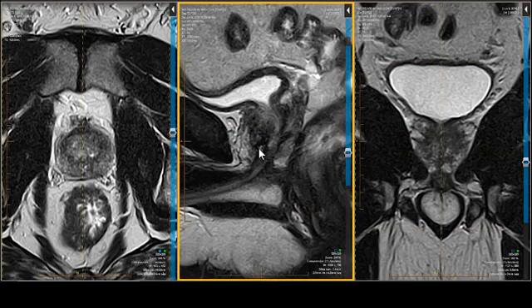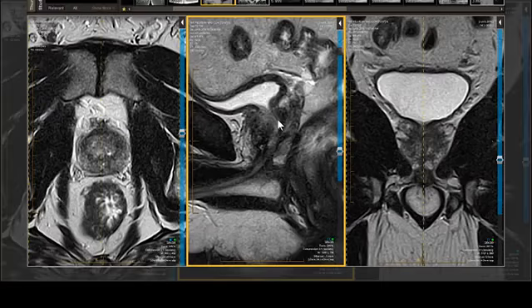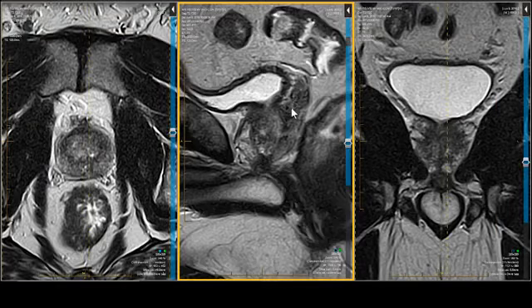In the sagittal projection, we see the urethral opening to help us identify the midline. It goes back and then goes forward as we come down. The periurethral tissues are just a little bit brighter than the rest of the central region of the prostate. Now, this area here that's a little bit dark, especially as we go off to the side, I'm going to draw over it right here, in the posterior superior quadrant. Now I'll go off to the side and follow it. That's the central zone of the prostate, part of the central region of the prostate.